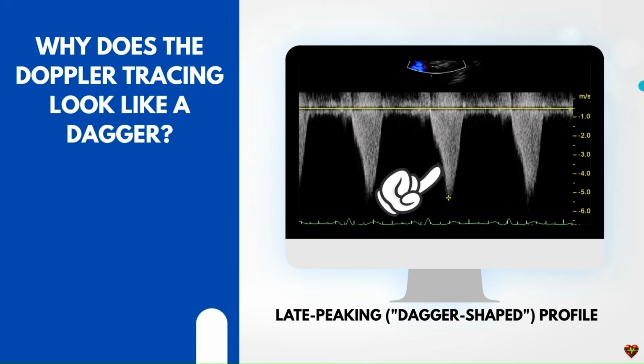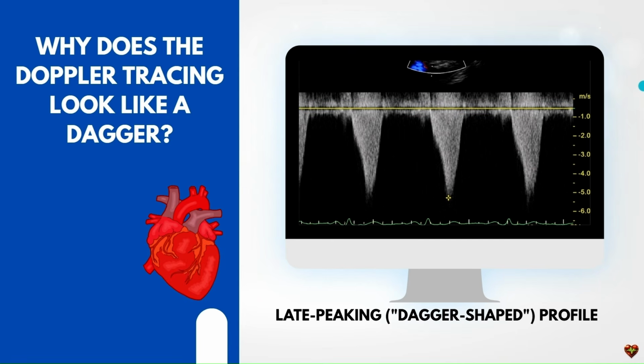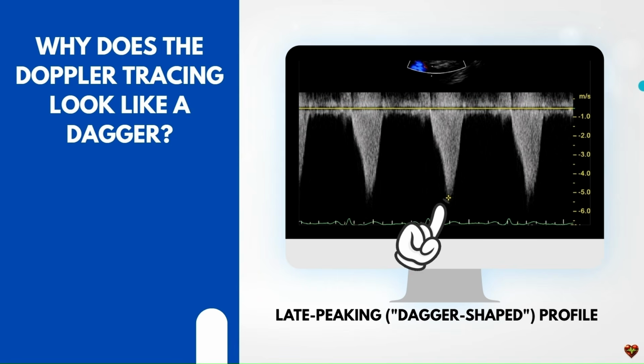The tracing is one of the most recognizable Doppler patterns in echocardiography. Students often memorize this dagger shape, but I want you to understand why it forms. Early in systole, obstruction is relatively mild because the ventricle has just begun to contract. As systole progresses, the ventricular cavity becomes smaller. SAM becomes more pronounced. The outflow tract narrows further. Blood velocity continues to rise until very late in systole. That progressive increase in velocity provides the classic late peaking dagger-shaped spectral envelope. Once you understand the physiology, you no longer have to memorize the pattern.